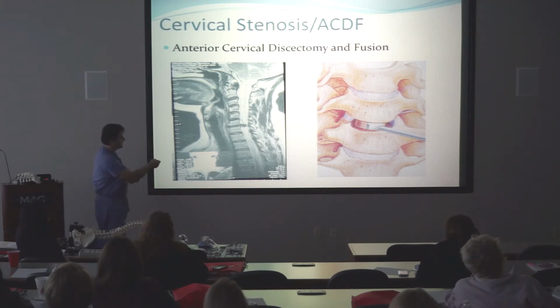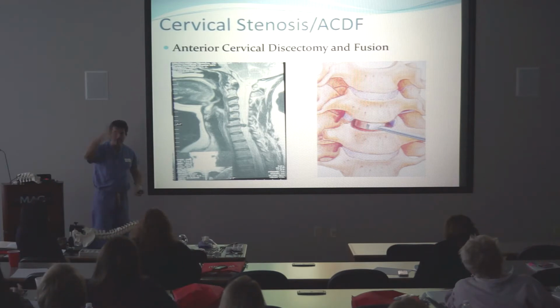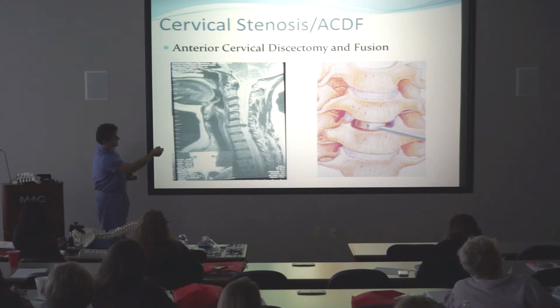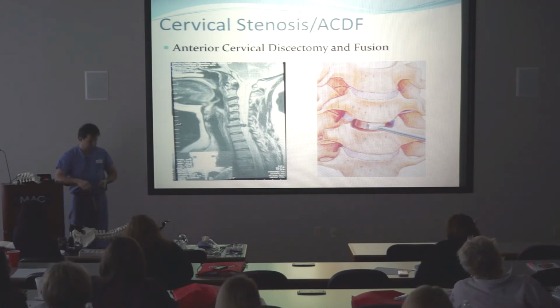Well, you can see. I'll show you up on the model here too. You make an incision and clean out this disc space. There are little pins we put in this bone that stick up through the wound. Then you spread those two pins apart and open this up wider so you can see in there, and you have a microscope or microscopic lenses on. You're looking back here, cleaning this stuff out. Part of the surgery is you see this corner of bone sticking out right here, and that gets cleaned off, and this corner of bone right here gets cleaned off as well. So you end up with a pretty decent window to get that disc out and see the spinal cord come back towards you.